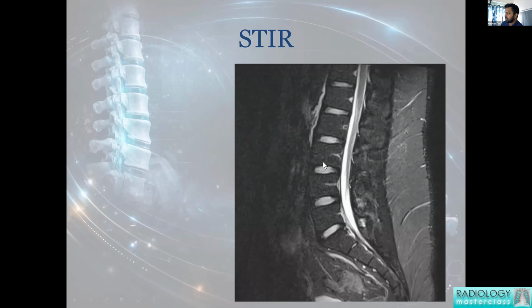That is because in MRI we don't see bone. We see only bone marrow. Bone marrow is mostly comprised of fat, so that also gets suppressed because of that. And the disc has more nucleus pulposus and fluid in it.